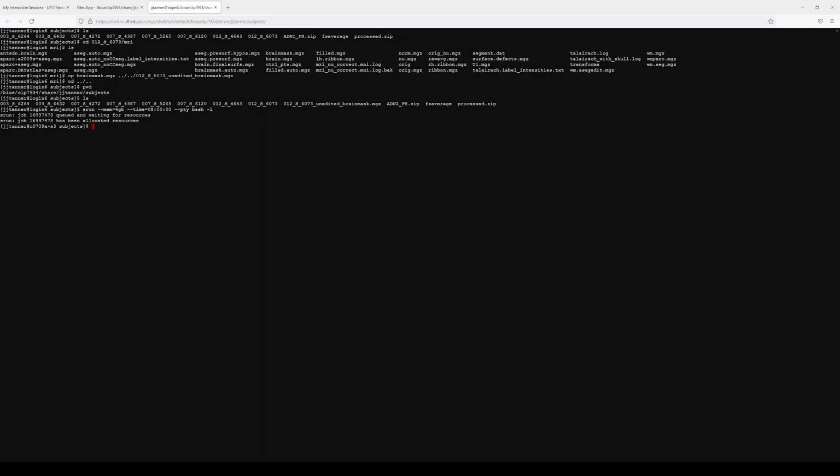So I can module load FreeSurfer. I'm going to do 7.1.1, and then export SUBJECTS_DIR, and I'm already in that location, so I can make that equal to this variable called present working directory. And just to verify that that really worked, SUBJECTS_DIR is where I am. And so we had done edits to this participant, and I had cleaned up the white matter a little bit.